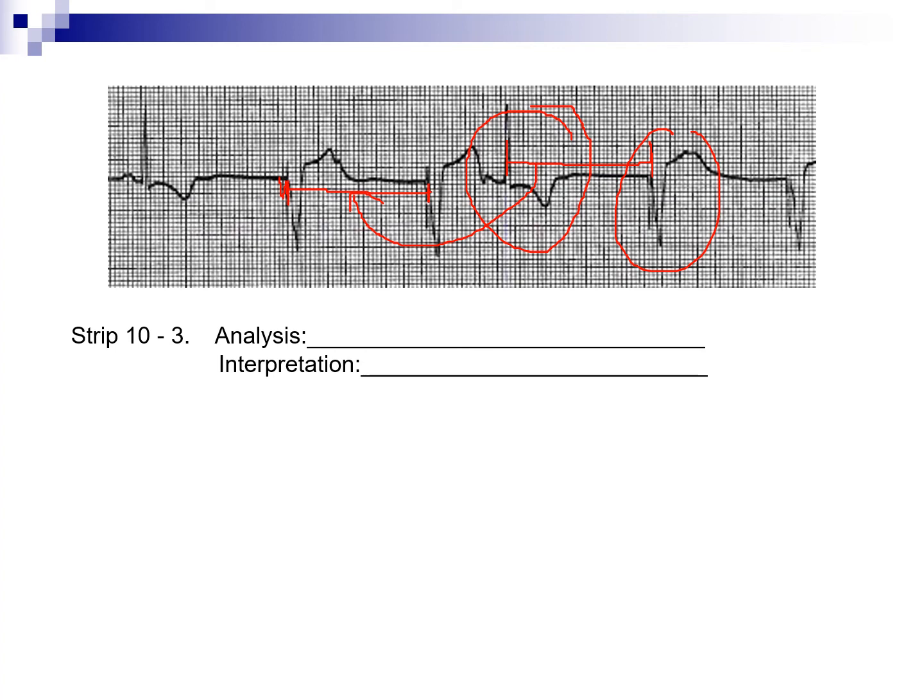If you were to do the heart rate on this pacer, this is about 48. This patient's own beat from the pacer spike to the patient's own beat is about 83. So know that the patient's own beat came in, which is good because we only want the pacers to kick in when we need them to kick in. So this is a properly functioning, normal pacer. It's sensing the patient's own beat and every time it does fire, it is capturing. So let's take these off.